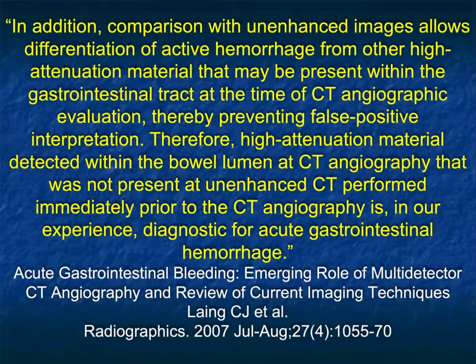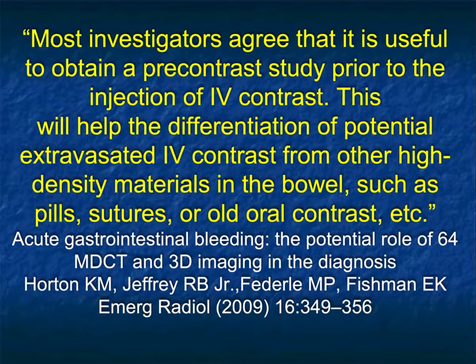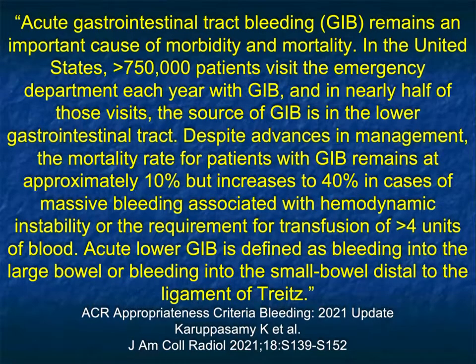Most of us have stopped doing the non-contrast for a long time. Again, the reason for the non-contrast was to make certain you're not overcalling some foreign matter as a bleed. But again, every bleed I've ever seen will change density and appearance between arterial and venous phase imaging.